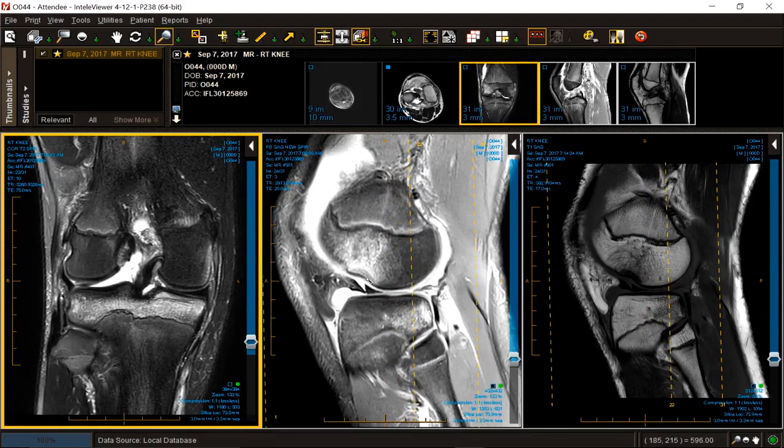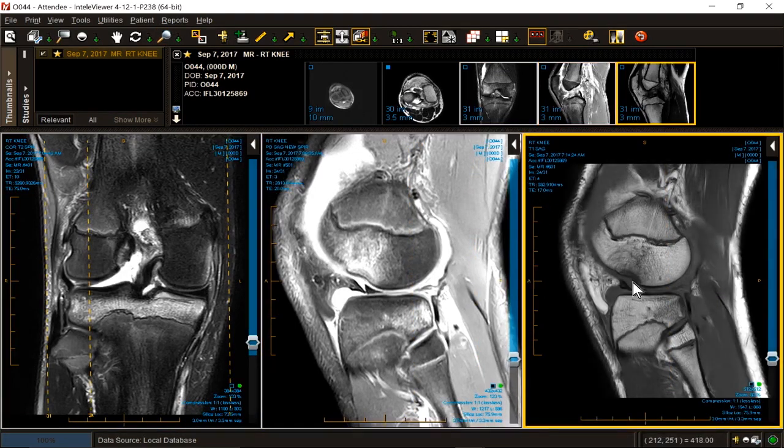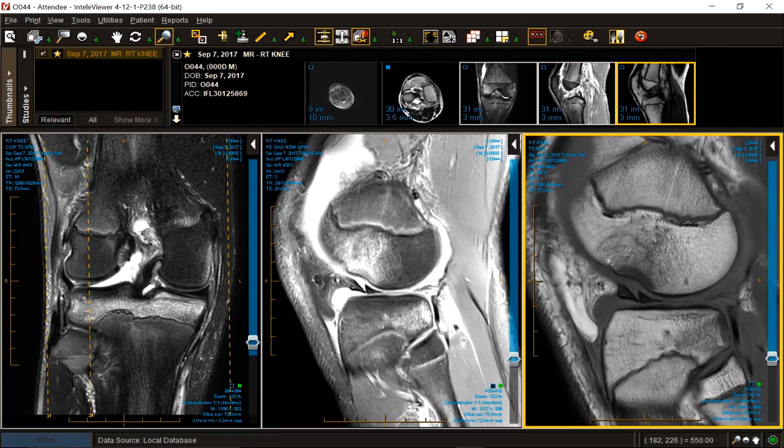There is a depressed femoral terminal sulcus fracture. I didn't say microfracture. I didn't say contusion. I said fracture. It's depressed. Cortical break, fracture. Depression, fracture. These are microtrabecular components of the fracture. Spidery, contusive components, macrofracture, depression, undulation, but non-kissing. Remember our knee dislocation? Kissing. This time, pivot shift.